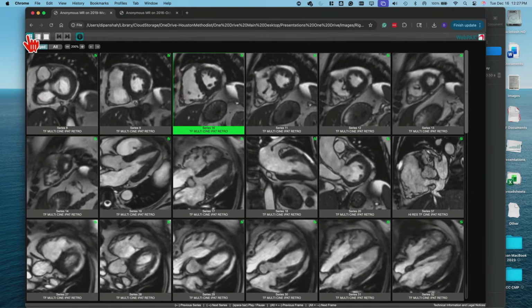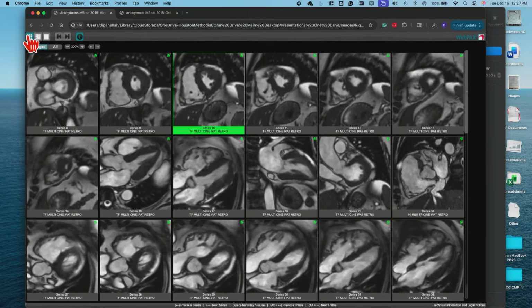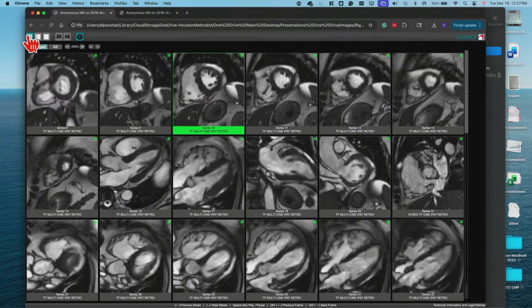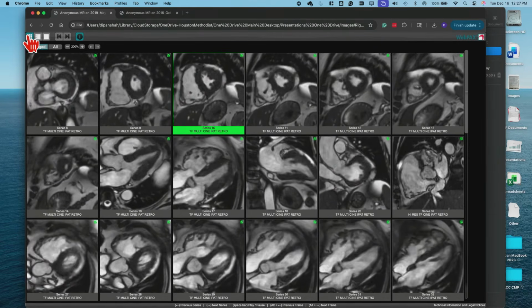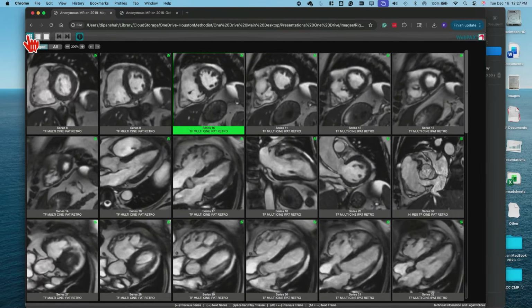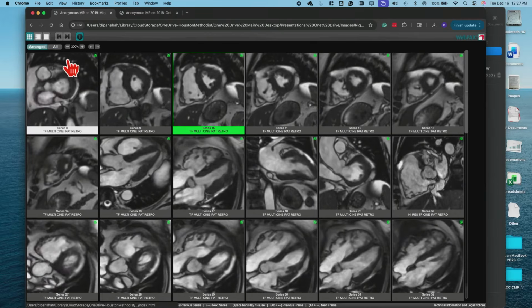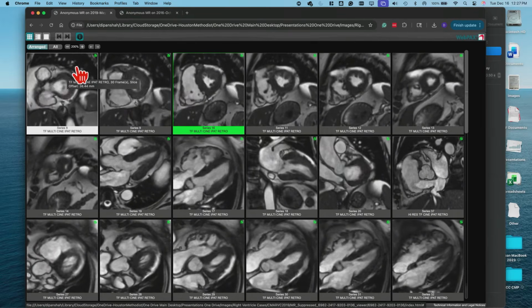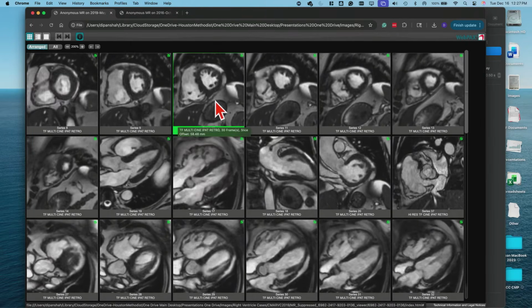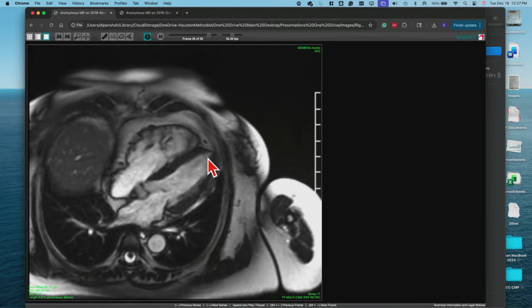As Dr. Naga talked to you about last week, if you have volume overload, when does that cause the flattening? In systole or diastole? Diastole. If you have pressure overload, when does it cause it? Systole, but it could also then affect diastole as well, right? Okay. And in this case, you say, okay, I see some mild flattening, and it may be in both, so it may make you think there may be some pressure overload to this right ventricle. The right ventricle is big. And then going back again to the wall, the free wall?